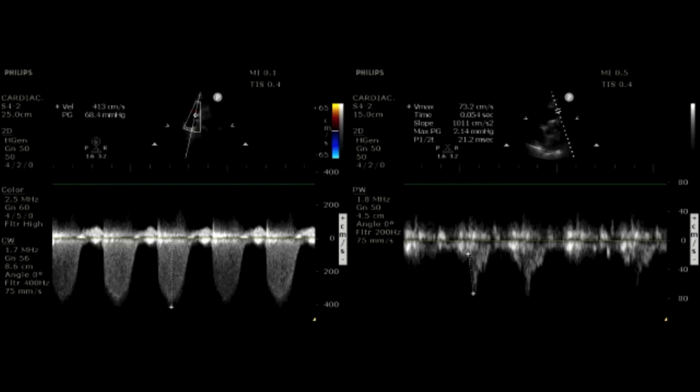So Ashish, go ahead and just give us your thoughts as a cardiologist. Maybe I can chime in as an ED physician as well. I'll let you go first on this one, and then maybe I can add something to that.